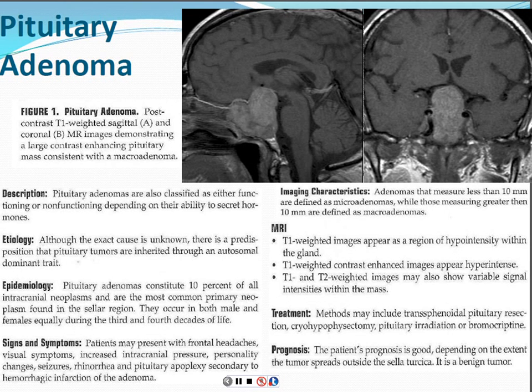This is another one of those lesions that you want to be able to describe and show to the surgeon, its relation to the surrounding structures, the blood vessels and everything. Obviously, the optic chiasm, where your optic nerves come together and go back out towards your occipital lobes. So it's important to get good imaging of these.